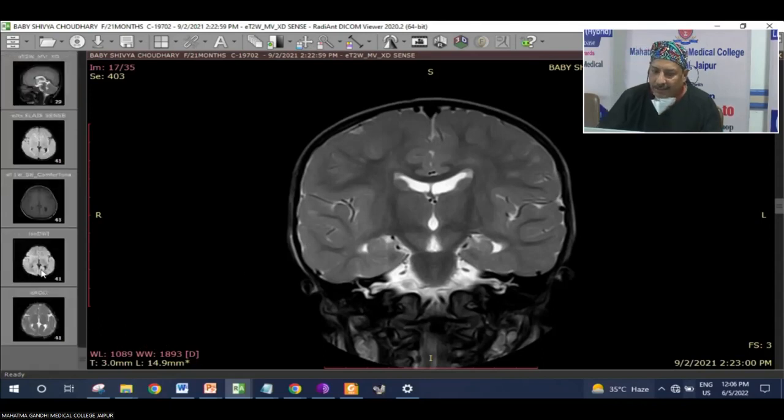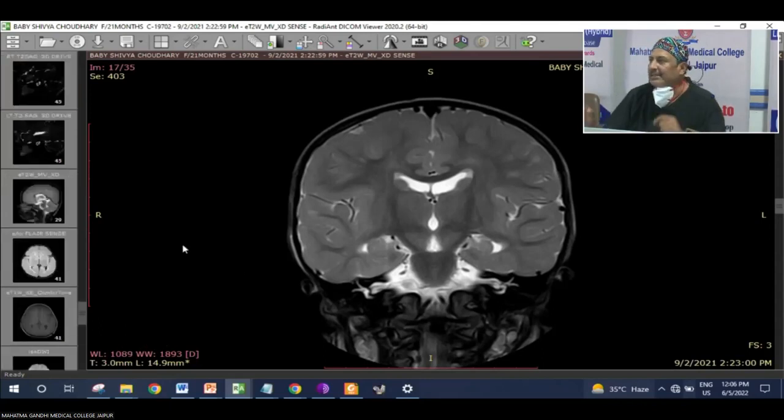And the sequence we take into consideration for that is a 3D FLAIR. In 3D FLAIR, the cochlear fluid signal is dark, just opposite of the FIESTA sequence. In that situation, if you see any slightest change in protein concentration in the cochlea in a post-meningitis situation, you can imagine cochlear ossification is likely. That is a very high likelihood of cochlear ossification. And that is the time to take a call of implanting.